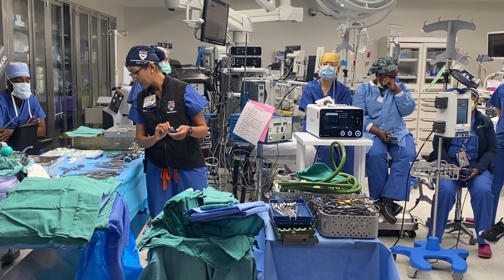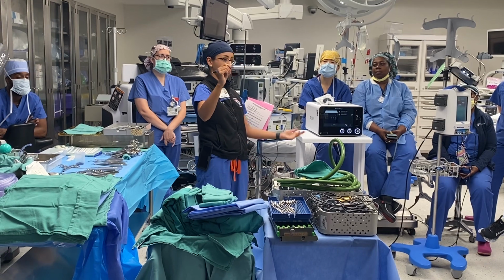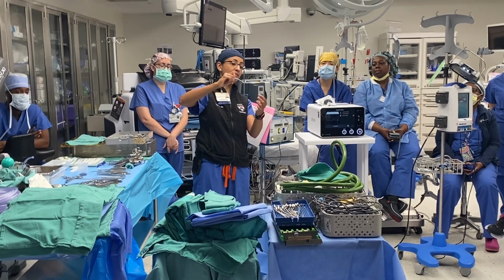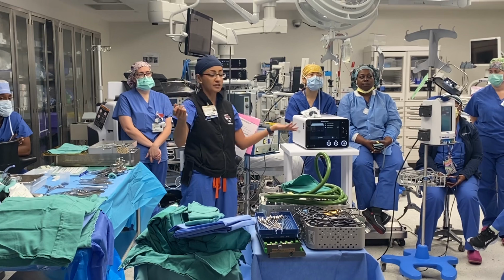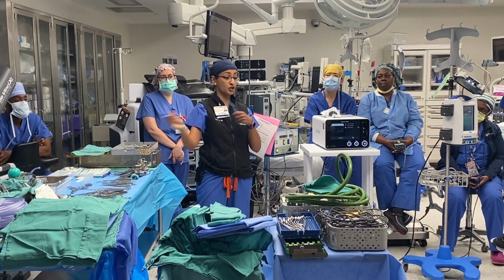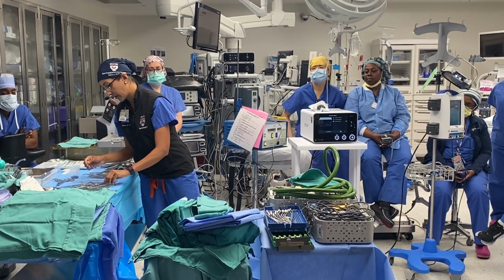And there's different ones. This one's a nice insulated one, the blue part's insulated. These only work at the tips, okay? So you'll hear us say, can you clean the tips for us, please? That's because as we coagulate, there'll be char that builds up in between the tips, and then it doesn't work. So those are important, and usually we have a couple of them on the set, so I tend to just swap out while we clean those tips, because that allows us to keep that going.